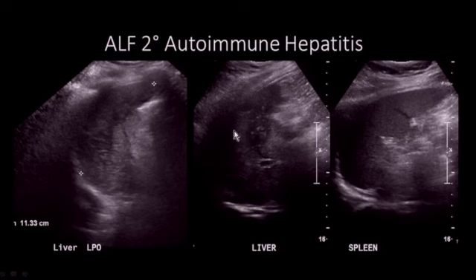Again, some areas of echogenic liver, other areas hypoechoic with the bright portal triads. And already it's starting to be a little bit heterogeneous, you can see, compared to the spleen, which is actually now larger than the liver. The liver has shrunk considerably.